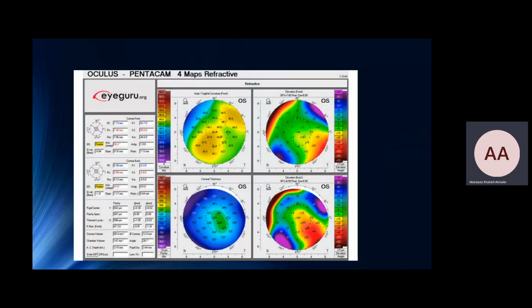And let's take a quick pop quiz. Can anyone interpret this map, or tell me what you want to look for in this map, following the 12 points that we mentioned? Dr. Tafadhal. Okay.